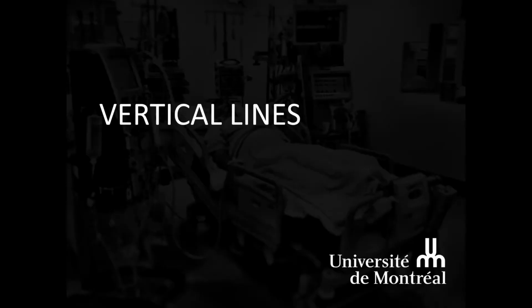We will now go over vertical lines. For the purpose of this talk, we will be referring to all lines that are vertical as vertical lines and not B-lines, as B-lines tend to be associated with a specific interstitial process, whereas a lot of other features can lead to what appears to be vertical lines.